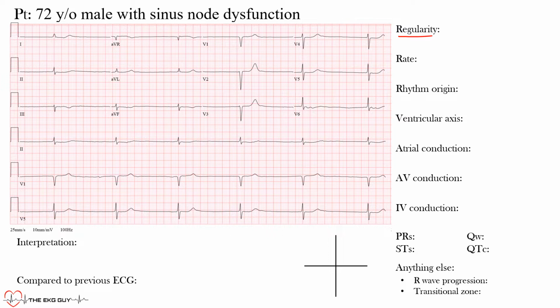In this case, we want the regularities, meaning the distance or time between intervals, to be consistent for it to be regular, okay? If it's not, then we would call that an irregular rhythm, and then from there we'd have to find out if there is any regularity to that irregularity, okay? In which case it would be a regularly irregular rhythm, or if it was always irregular, such as atrial fibrillation, which is an irregularly irregular rhythm. Okay, so let's look here to see what we mean.